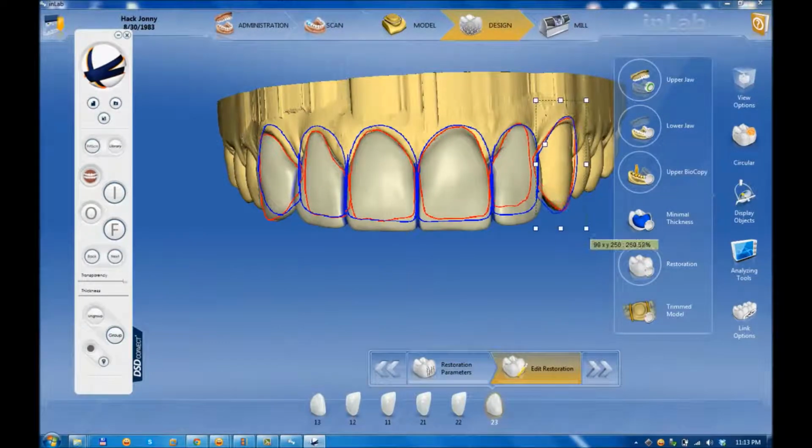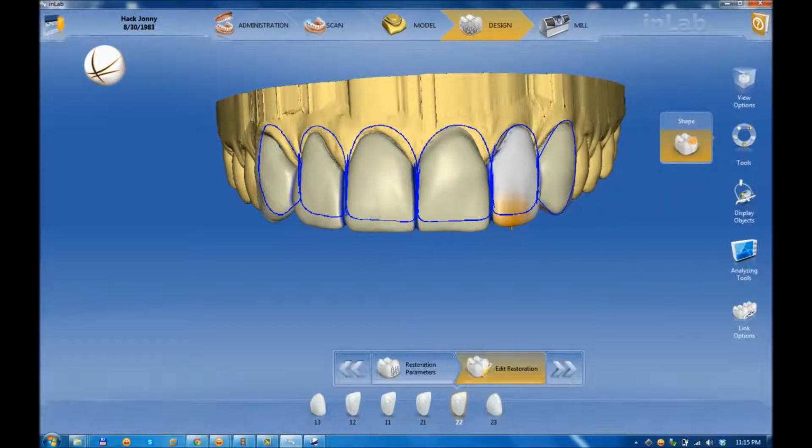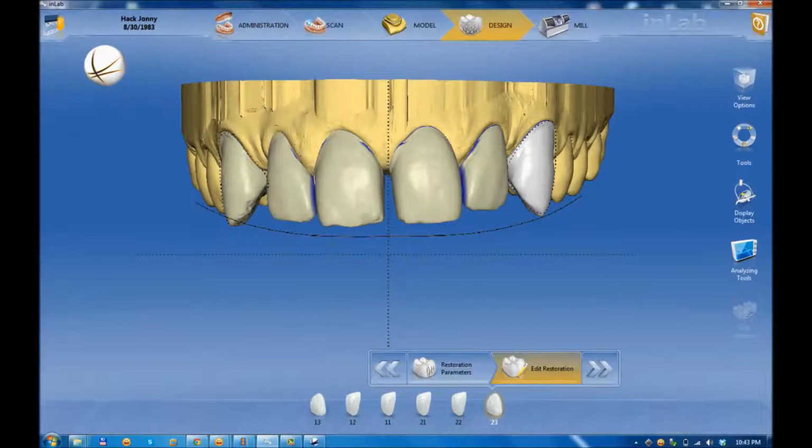After finalizing the calibration of the DSD images with the 3D model, using a double click on the DSD Connect logo from the menu bar, the DSD image will remain blocked over any other software on the computer. In this situation, during the CAD/CAM design, we will be guided according to the information obtained in the digital smile design. Unblocking the DSD Connect application is done by a double click on the DSD Connect logo, returning to the menu of the application.